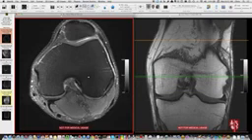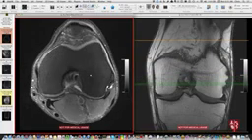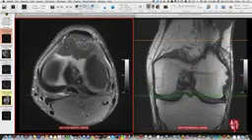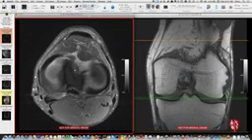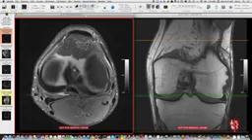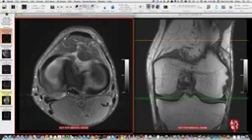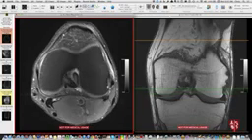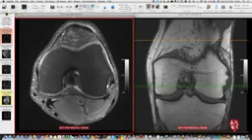So you've got to use all three planes to reinforce and refine and grade what you think about ACL tears. So ACL from here all the way down to this foot plate here, and fanning out. The PCL is actually nicely seen here as well. So here's the PCL posteriorly, should be a thick black band, ovoid structure attaching on the tibia, and then here's the horizontal part of it here. Okay.